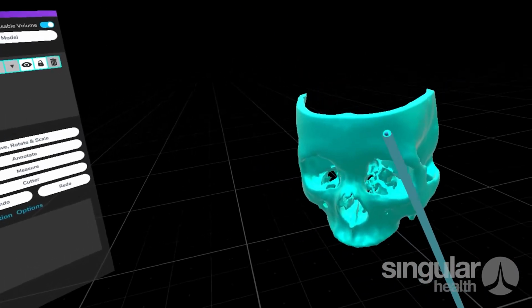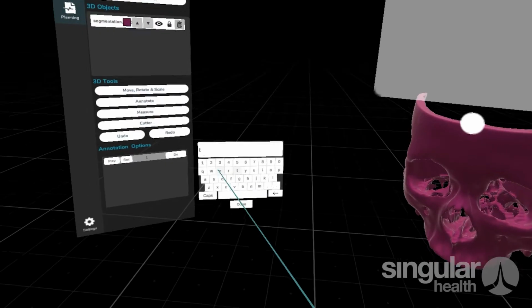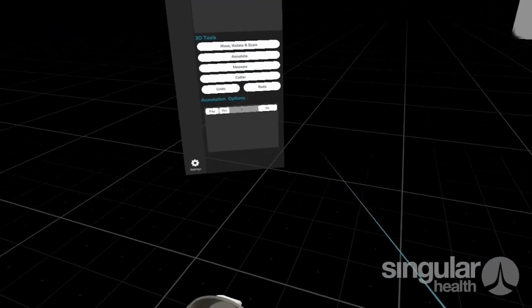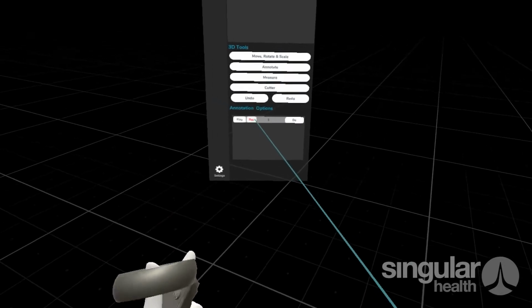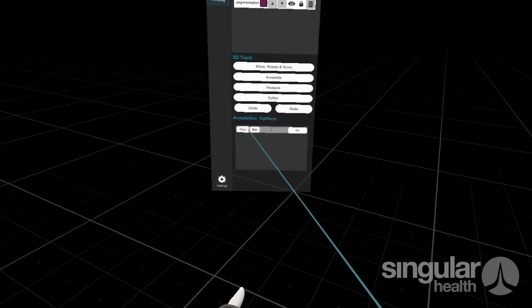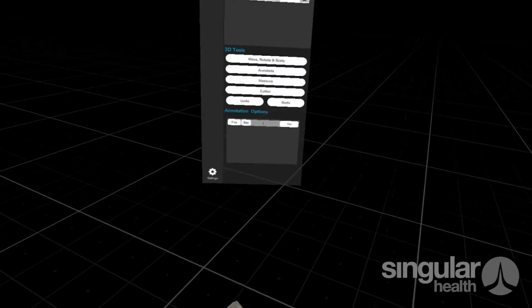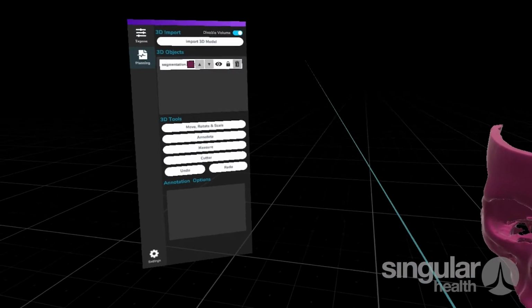This lets us, as it suggests, place annotations on the mesh. And then we can obviously type messages as we need to. You can actually record as well. This will be recording a message now, and it will play it back to you as you go along, and that all just gets attached to the model, and of course it's displayed on the mesh as well.